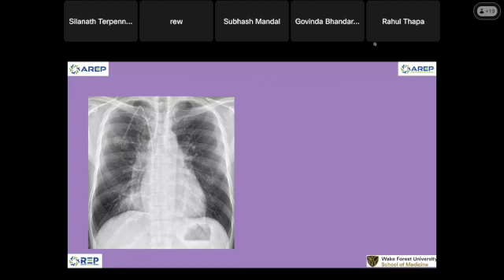What's going on with this patient? Big heart is really important. So we are seeing a shadow coming down here, right? Okay, big heart. We can tell. What else? This is the port.